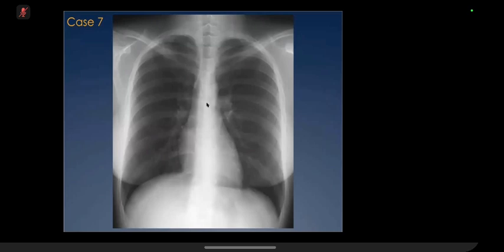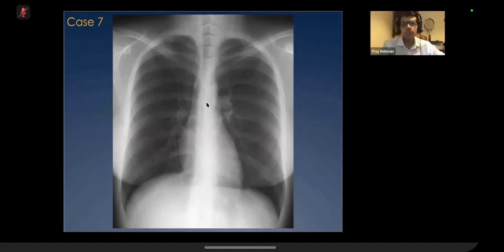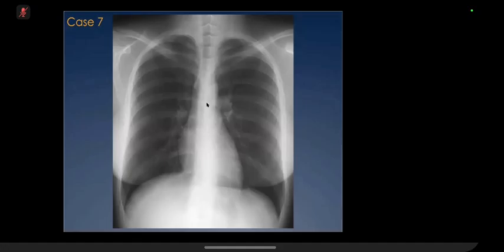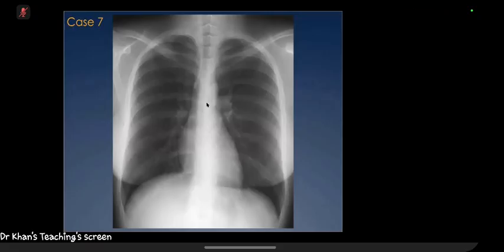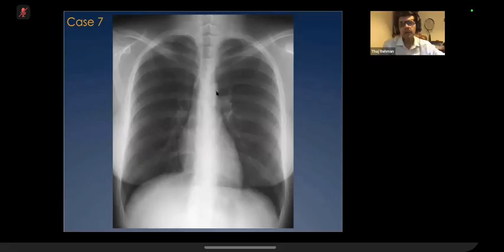So this is a frontal chest radiograph of a skeletal mature patient. I can see the aortic knuckle is relatively small, but I know this is not the theme of the presentation. So the aortic knuckle is fine. In a young patient, you don't expect a big aortic knuckle.